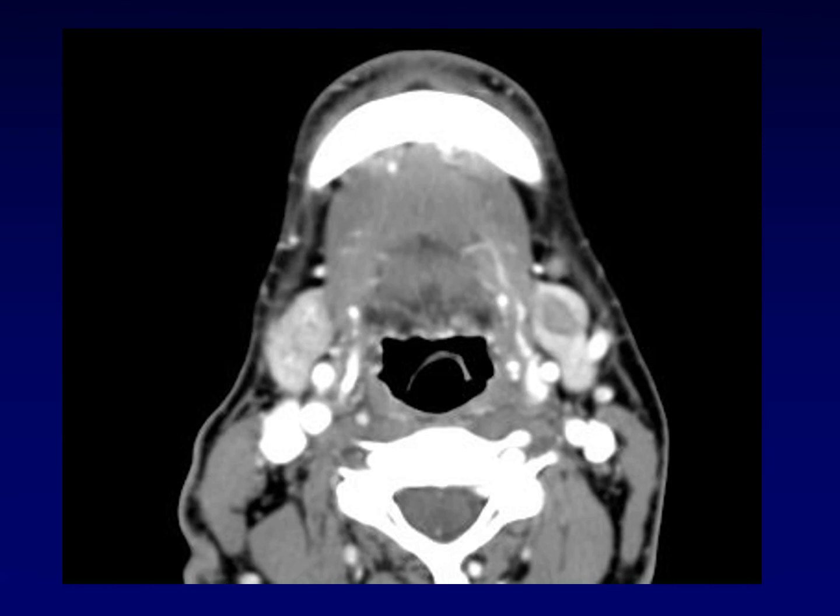Here's an example of a tumor that's not a tumor. This submandibular gland has an area in the center which is non-enhancing and would easily be mistaken for a malignancy. However, this turns out to be a chronic inflammatory disease. This is a Kuttner tumor of the submandibular gland. These are rare, but an important thing to remember on the differential diagnosis of submandibular masses.